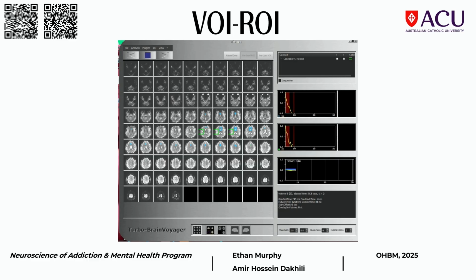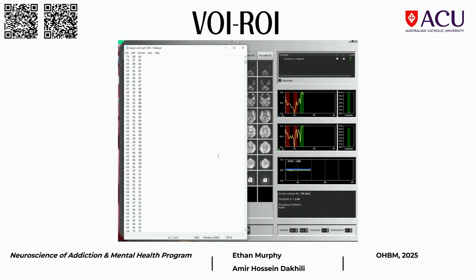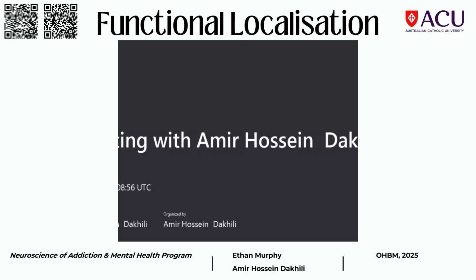But you can see here that something has gone wrong. The ROI is sitting way off the brain, which it's not supposed to. Our ROI is not outside the brain, funny enough. Yeah, and you see that it results in crashing TBV, which means that it couldn't actually find the thing. So, can you guess what went wrong?